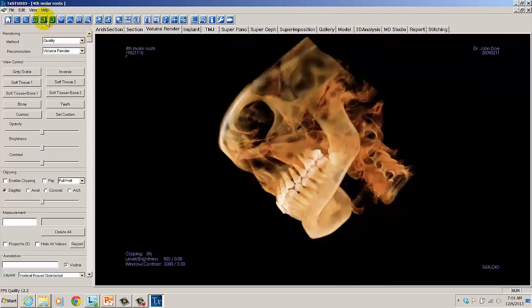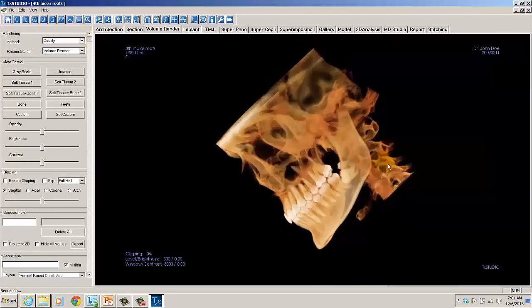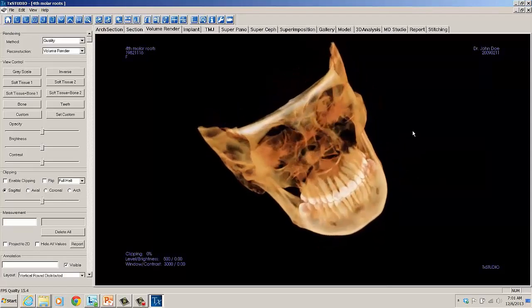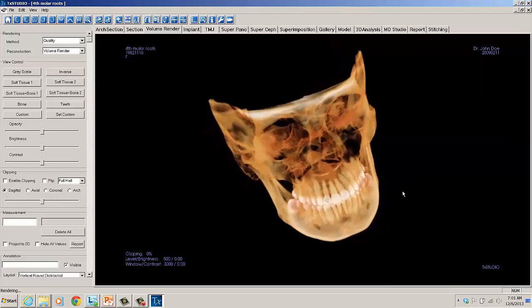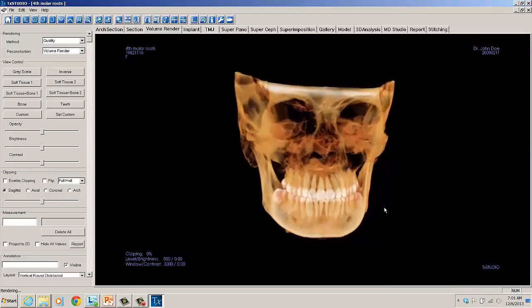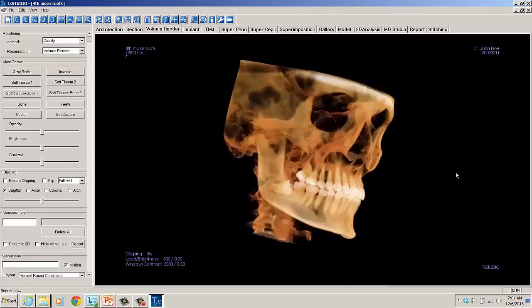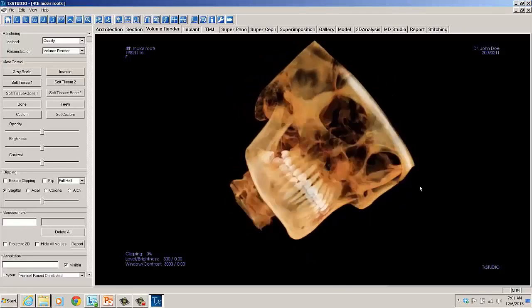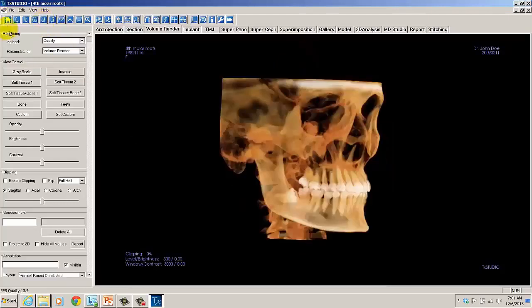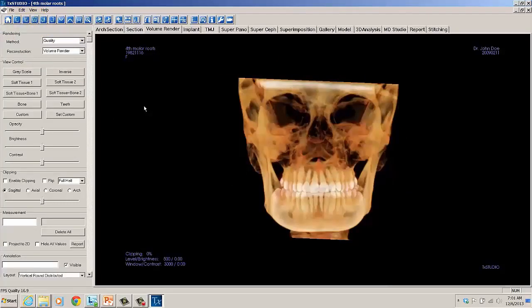And we have to use either our left mouse and get it back into the position we'd want, let's say, and then we can use our space bar on our keyboard, hold that down, left mouse button, rotate, and we can also tilt back up. So we can get it back in the position after a little bit of work, but to do this quickly, that's where you'd use the positional icons, and it would get you back in the correct default position.